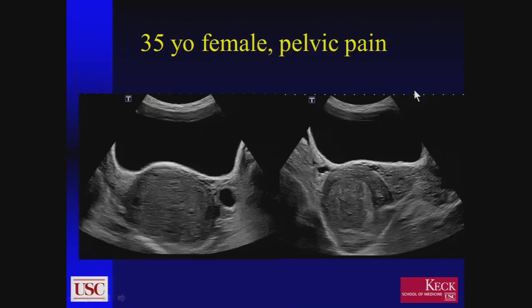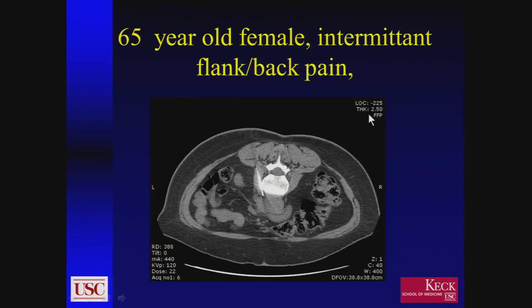And so this is another entity that can actually cause retroperitoneal masses, and this is retroperitoneal fibrosis. Obviously, she was probably obstructing intermittently her kidneys, but as I said, don't know that you can apply this to every case, but certainly when I see that lumpy, bumpy appearance, I tend to think more of metastatic disease or lymphoma versus the more smooth appearance that you get with retroperitoneal fibrosis. Again, they don't tend to be as grossly enlarged as the nodes that you get with lymphoma or with metastatic disease. And again, biopsy is pretty easy coming in from the back like that to make the differentiation if there's any question about that.